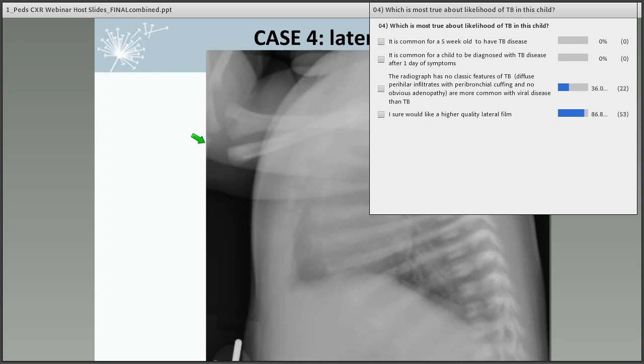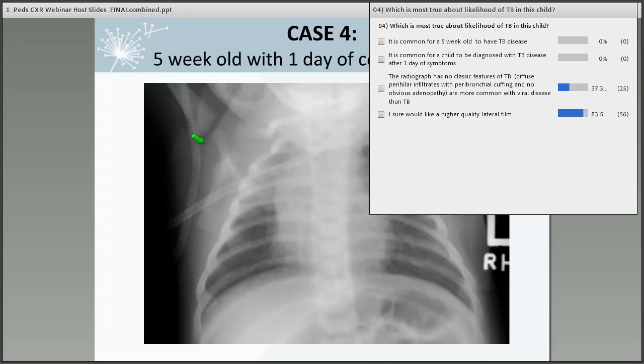I'm going to flip back to the frontal. And maybe you can think about some of the things that Dr. Vu was asking you to be looking for. And we can ask Dr. Vu to comment on these films. Great. Okay. Thank you, Ann.